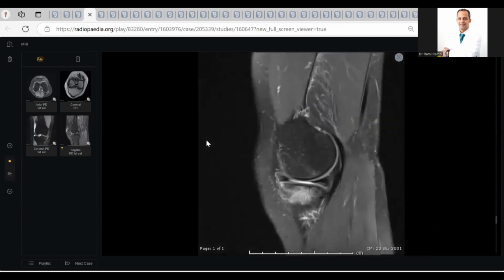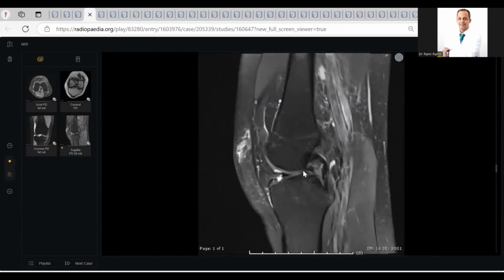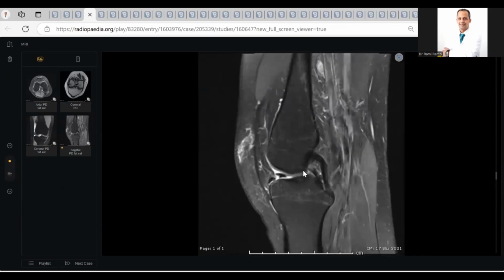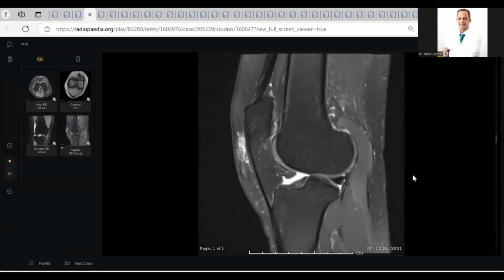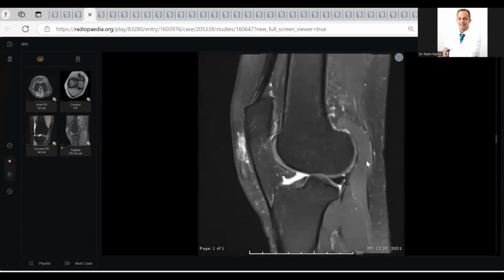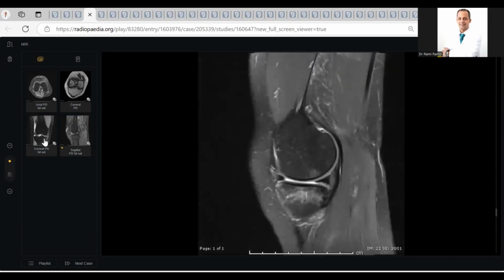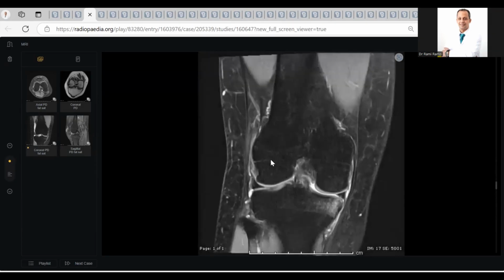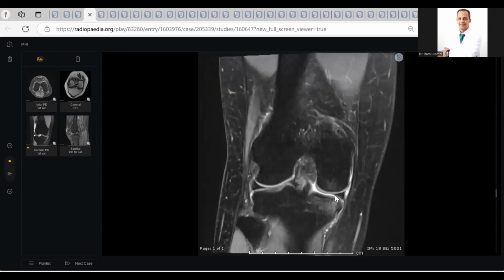This is not unhappy triad. Unhappy triad, okay, this is double PCL, and Radiopaedia mentions there is a double delta sign. This is what I asked you about. Lateral meniscus is good. ACL is not seen, associated with posterior femoral translation. This is very important to mention. Okay. If you want to diagnose unhappy triad, you should look at the medial collateral ligament, which is completely normal. So this is not unhappy triad.